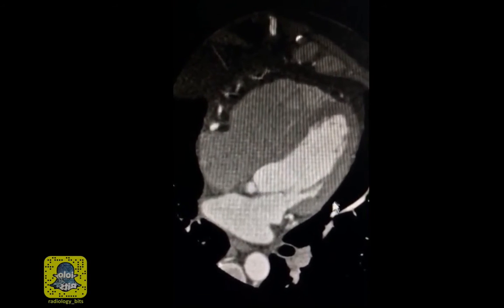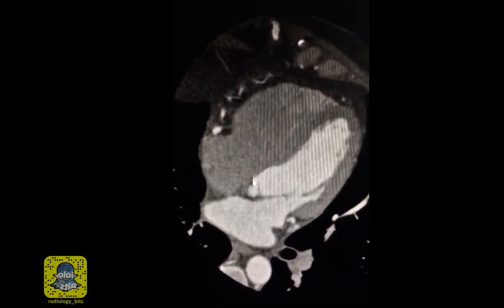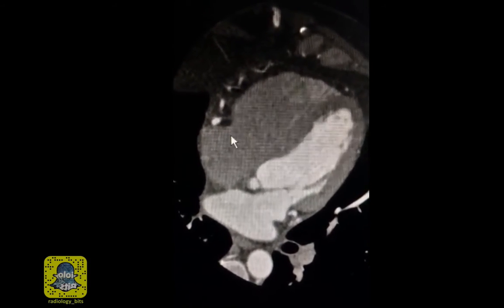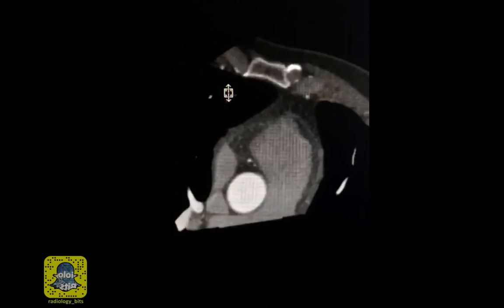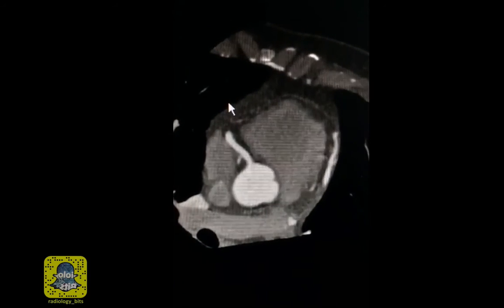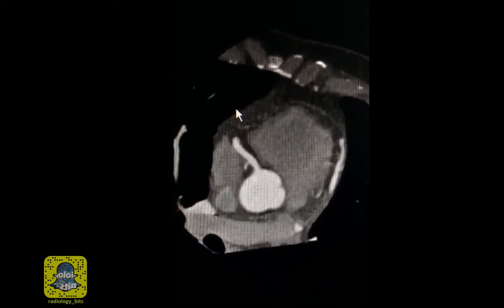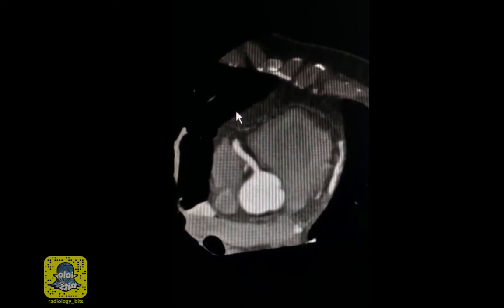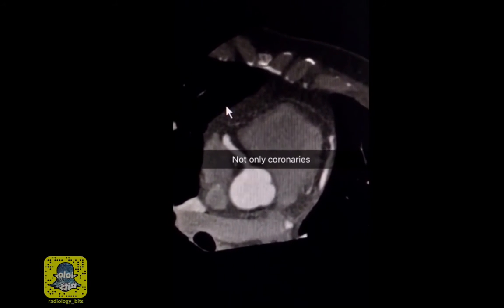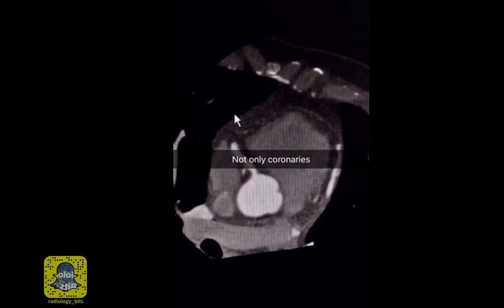In simple terms, you could look at big structures, or what we call a structural study, to look at the ventricles, the atria, and others. Or you could dedicate your exam to look at the coronary arteries, which is the most common indication. So remember, although that coronary artery assessment is the commonest indication, you have lots of other indications with cardiac imaging. It's not only about coronary arteries. In this clip, I'm going to concentrate on the main reason why we would do the coronary arteries by CT.